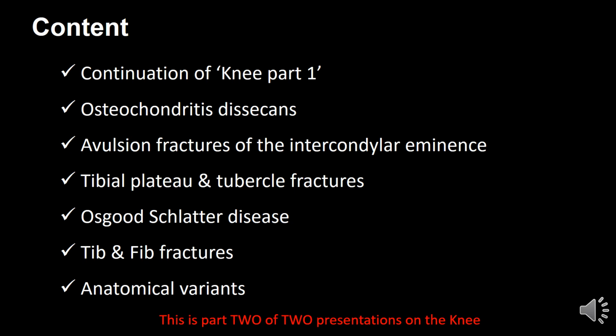Welcome to part 2 of this presentation on the knee. It's a continuation of part 1. So here we're going to present a range of fractures of the knee and the tibia and fibula, and also look at some of the anatomical variants.